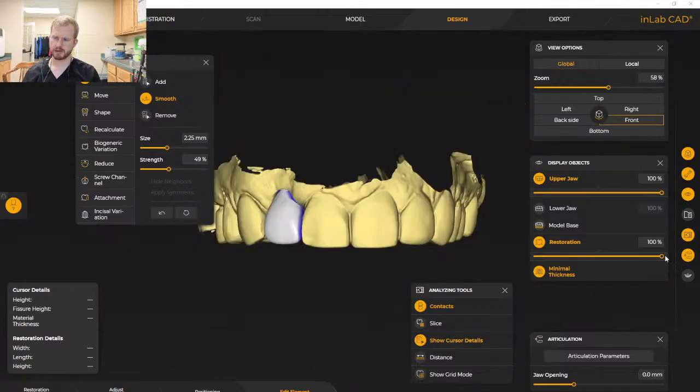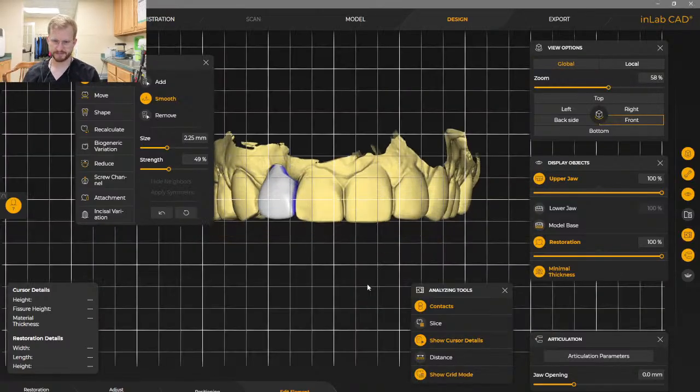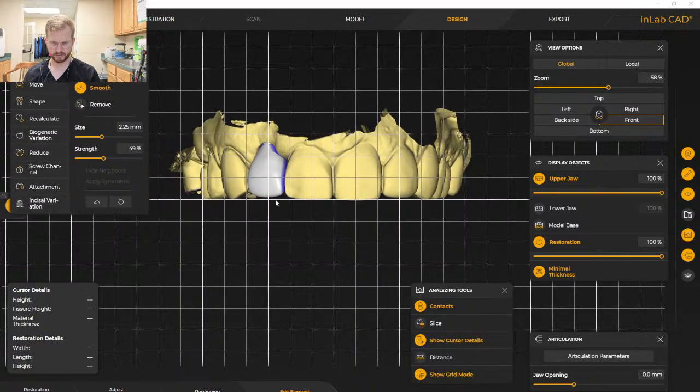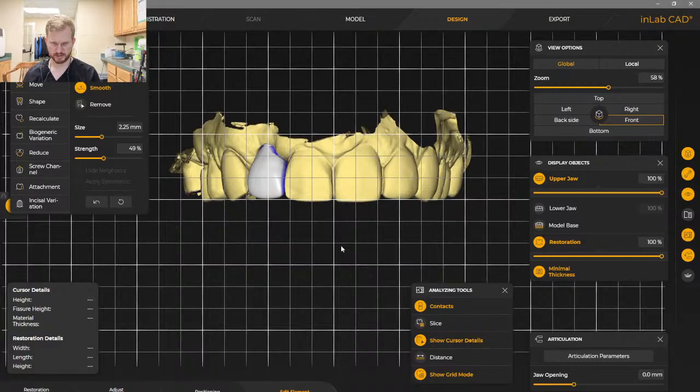One of the things I like to pull up when I'm doing this is our grid. So we're going to line up the centrals to evaluate the laterals. We're going to right click and slowly drop. Looks like the laterals are going to touch that line about the same time.